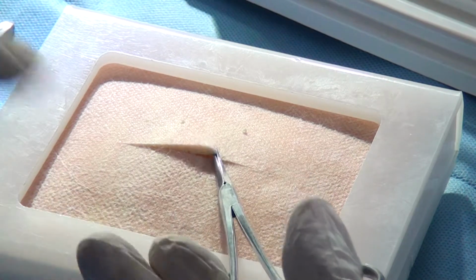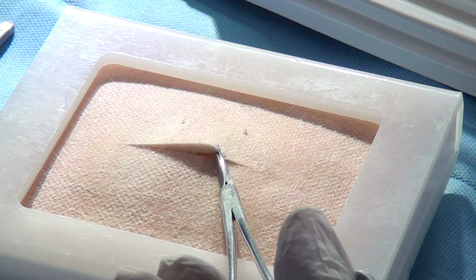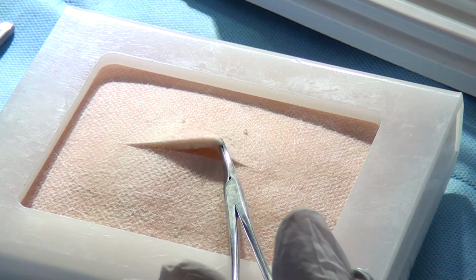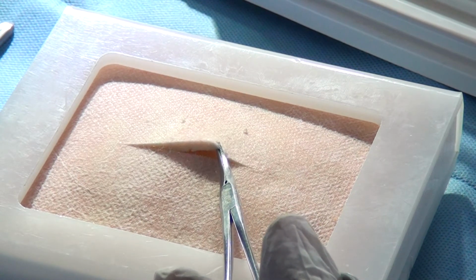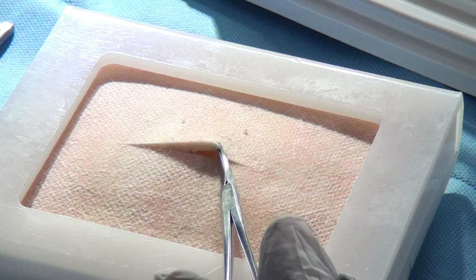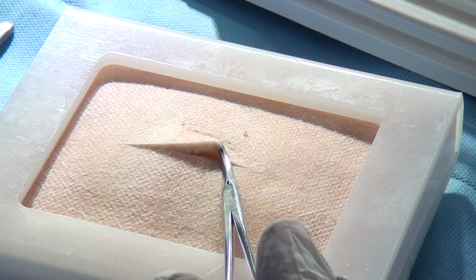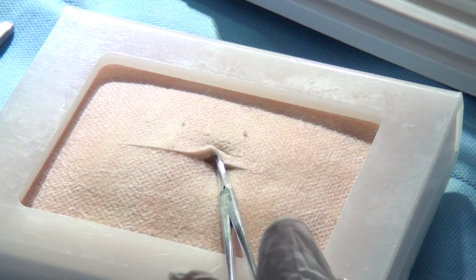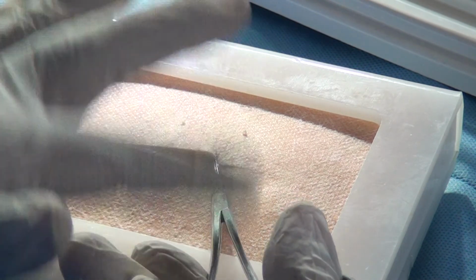Therefore, there are many ratchets. Because you don't need more than 4 teeth to bite and 6 teeth to chew. And you have 32. Why 32? So that you can afford to drop one every 10 years and still have 4 at the end. Same applies here. If you use all 3 first day, the instrument would wear out. So the ratchets have been provided for the wear and tear of the instrument.